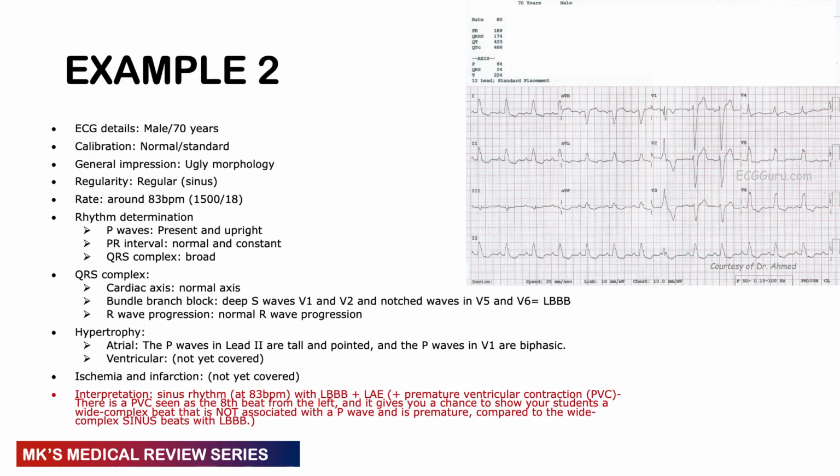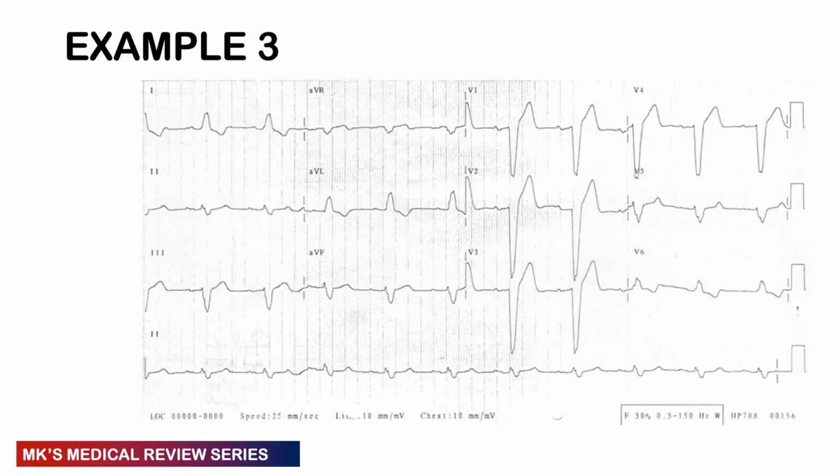So that's the example. Coming to the next example, which is example 3. I want you to pause the video, write down your answer, scream it at the screen, and work it out. And here comes the answer.